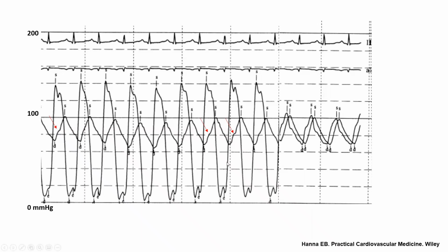I believe this is incorrect. Actually, the best gradient in aortic stenosis is the highest gradient. So you look at the tracing and find where the highest gradient is. Basically, after the longest RR comes the highest gradient, and this is the one you take, the longest RR.